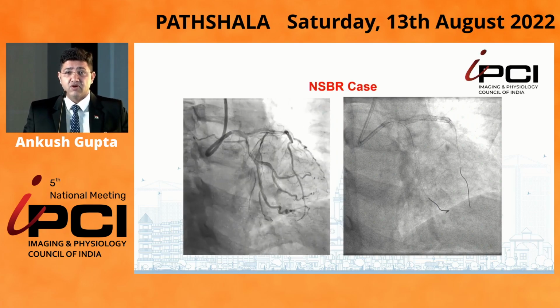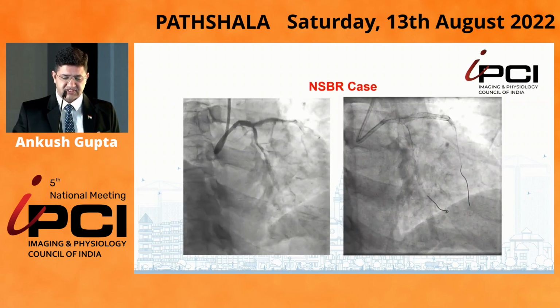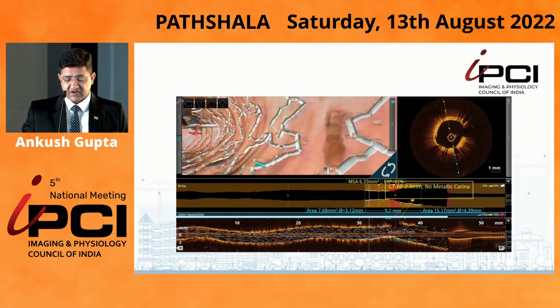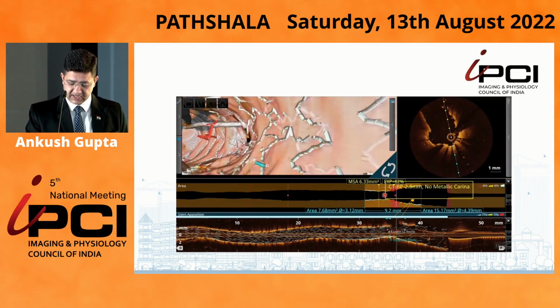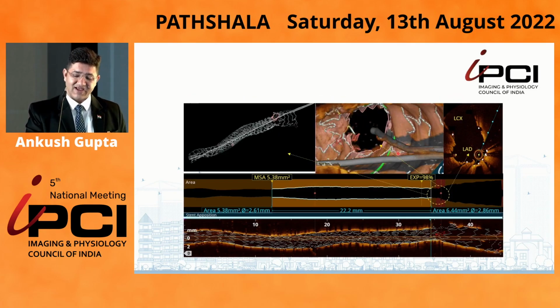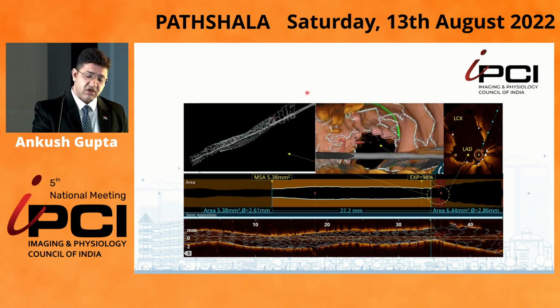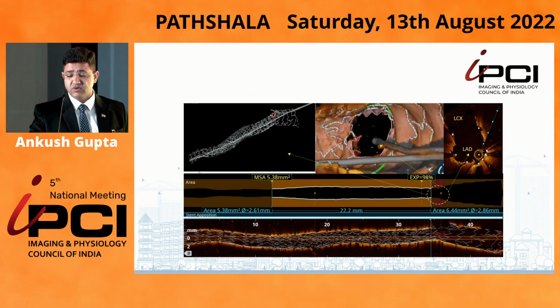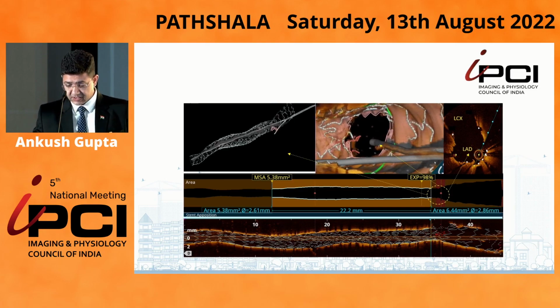This is the example of a case who didn't come to us with side branch restenosis. This is the pre-PCI, this is the post-PCI. And when we studied its index OCT, we found that there was hardly any new metallic carina. The side branch ostium was clear of any hanging stent struts, both on the 3D reconstruction as well as on the stent only view. And even in the cross-sectional view, it was a clear figure of 8 or Dumbbell sign that we have given it.